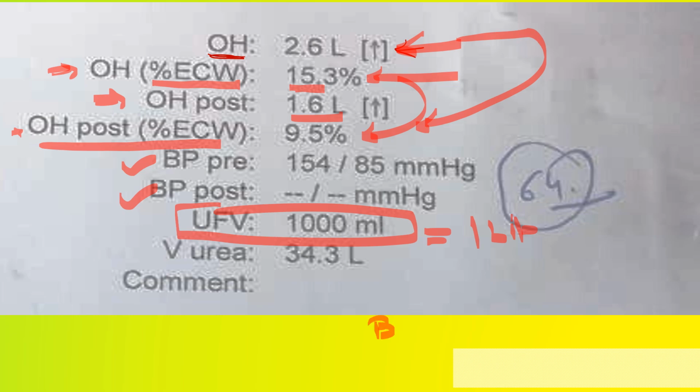So this bioimpedance also tells the ultrafiltrate, that the machine effectively removed whatever volume was set. And this also acts as another proof that dialysis has removed the water, apart from the routine weight monitoring.